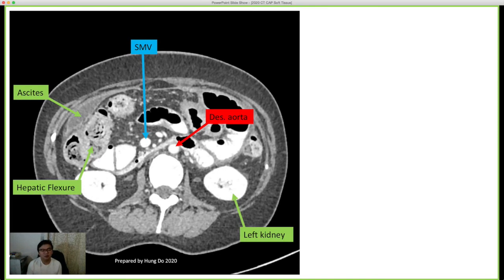At my place, we often give oral contrast because the patient has gynae or endometrial kind of female related cancers. With all those compartments and components downstairs, without the oral contrast, it can be challenging to see where bowel starts, where bowel ends, and where other structures start and end. So the oral contrast is useful for that as well.